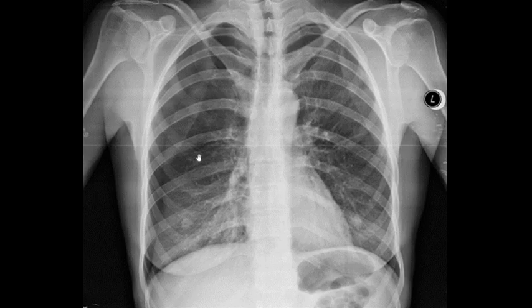Now, if we go to this side, here is the hilum. We now follow these vascular markings, and we see it is very hard to find them, or they are actually not present. We see that this is dark. This is maybe not the best quality, but for any X-ray you look at, even your first X-rays, if they are lower quality, that is better, because then it will be easier to look at high quality X-rays. So here we can see there is a line.